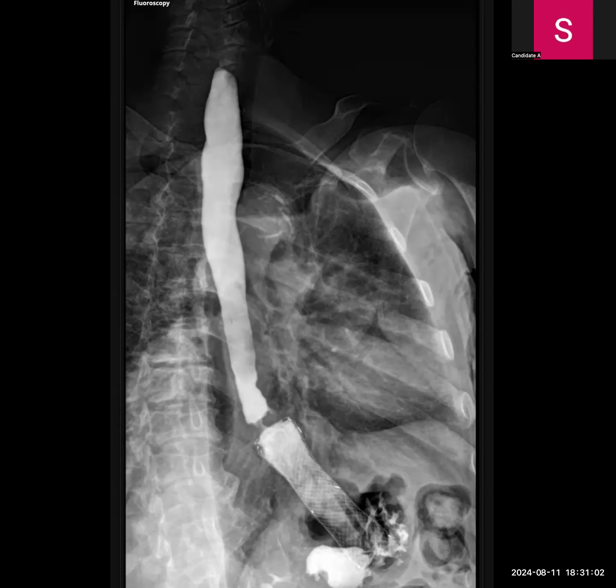Other than that, it could be, if this is a gastric pull-through operation with stent. No, no, don't go there. It's not a gastric pull-through operation. That's okay. We'll move on to the next case.